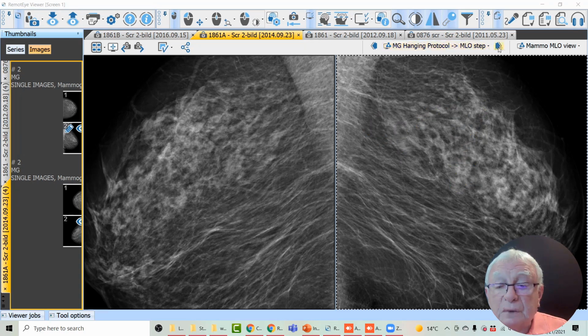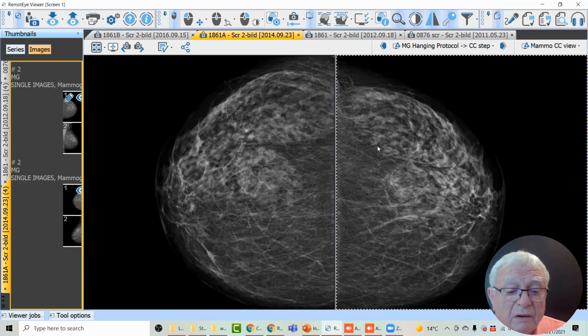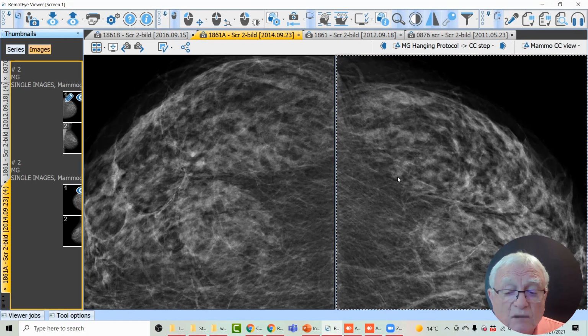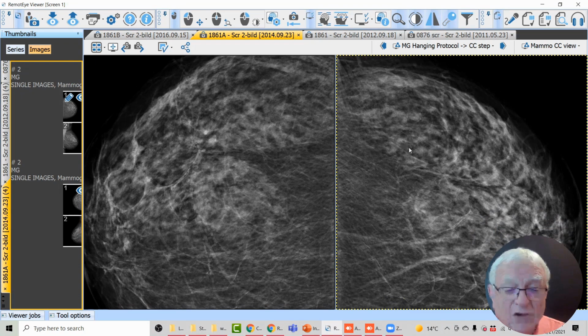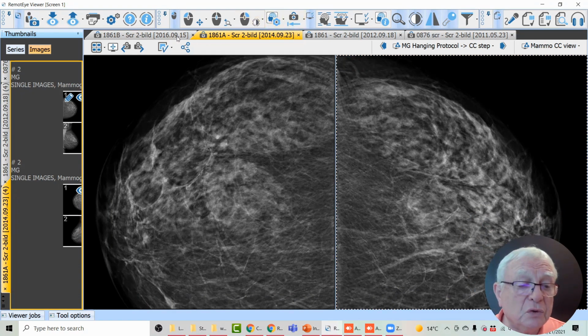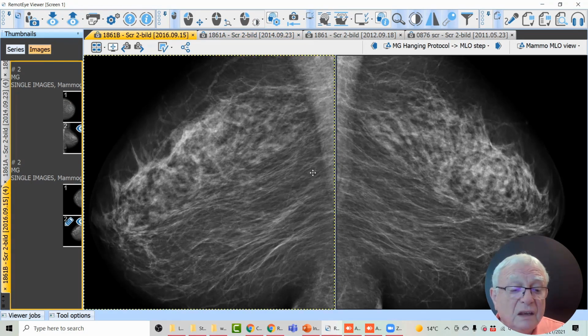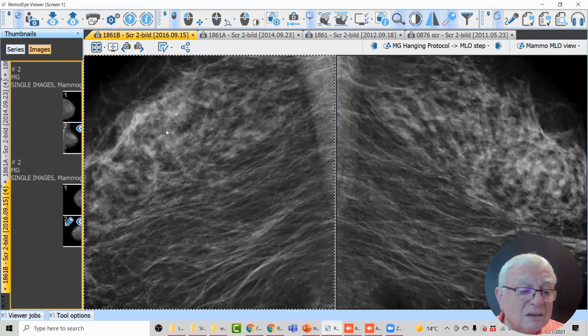Let's look at the CC projection of the same case. Window leveling a little bit. Please take home message: don't ever look at a mammogram without enlarging and making the picture darker. And then I show you, just to gain credibility, another 2 years later. And so you make it darker, which means I develop the fat. And it's all TDLU and fat and TDLU fat.